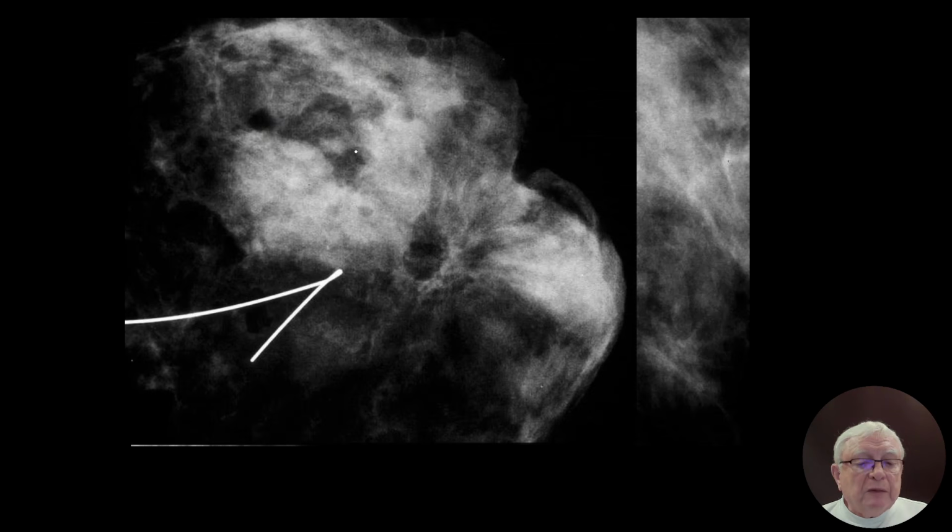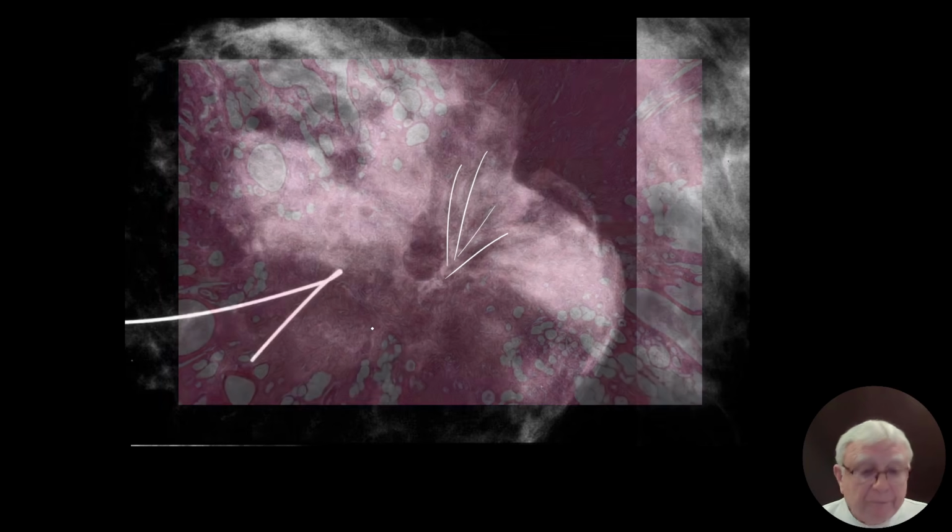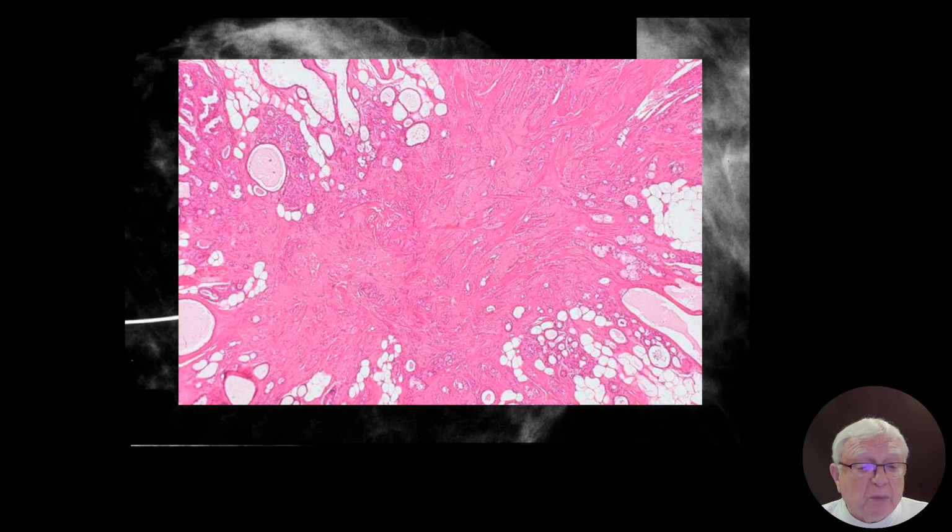Here it is. Now it's black. You see? Black star. Quite a sizable central fibroelastic core.